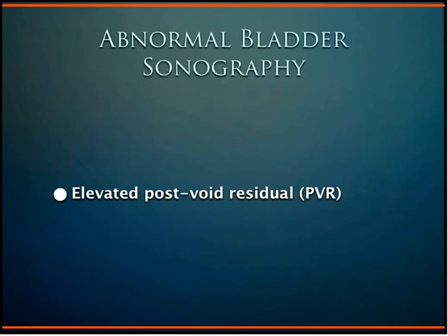Acute or chronic urinary retention can present with suprapubic pain and decreased urine output. In thin patients, a mass is sometimes palpated in the lower abdomen pelvis region if the patient indeed has a full bladder. However, if a patient voids, there is often confusion of whether or not they completely emptied their bladder or whether the amount that was voided was only a fraction of what remains. In these cases, post-void residual using bedside ultrasound is indicated.